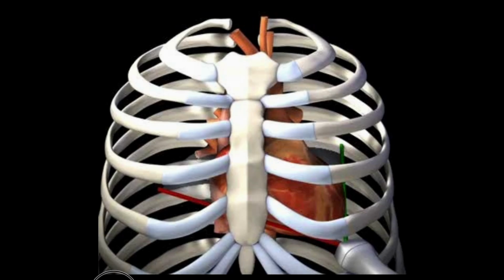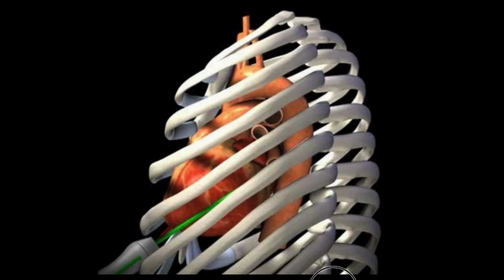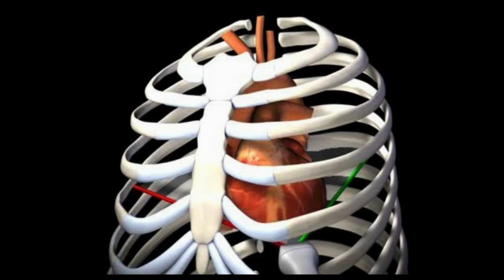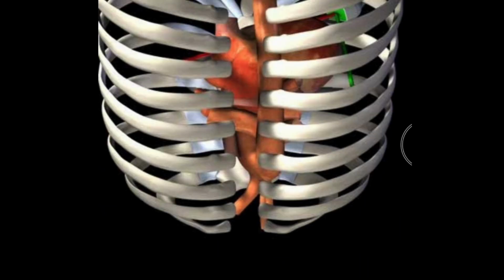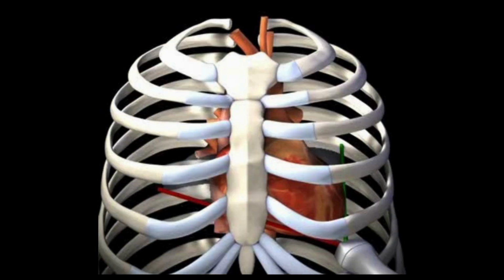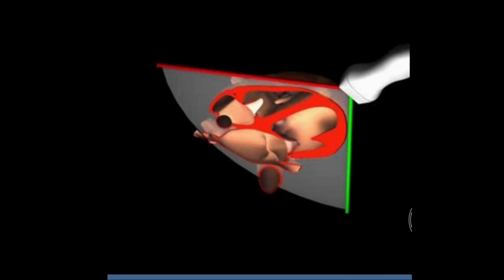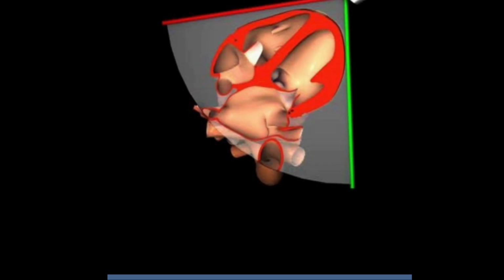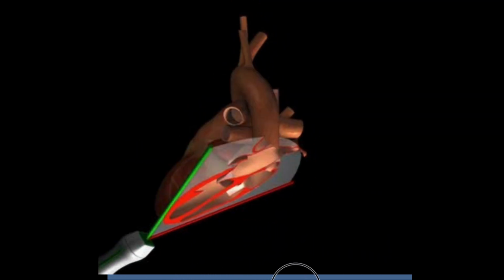Again, I know I probably sound like a broken record by now, every single time I show these 3D images from the University Health Network virtual transthoracic echo webpage. But I want you all to appreciate the green line here that belongs to the probe indicator. And as you can see, we're coming from the apex of the heart and also cutting the heart in a longitudinal aspect. But now the closer structure to the near field of the screen is going to be the apex, because that's the closer structure to the probe.